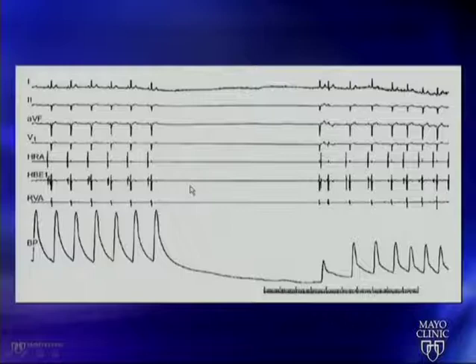Why do you think this patient would have both an issue with the sinus node and the AV node? Well, the most common scenario where there's a simultaneous problem with the sinus node and AV node is an autonomic issue, usually too much vagal tone. And one of the contexts where we see this is during a tilt table test.